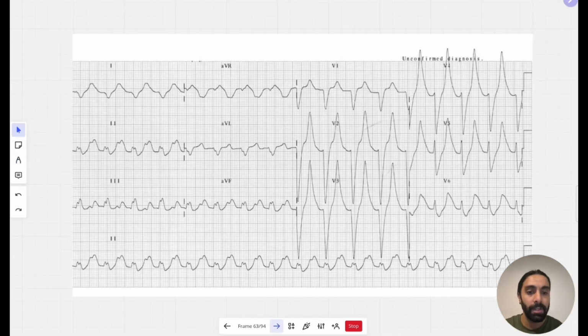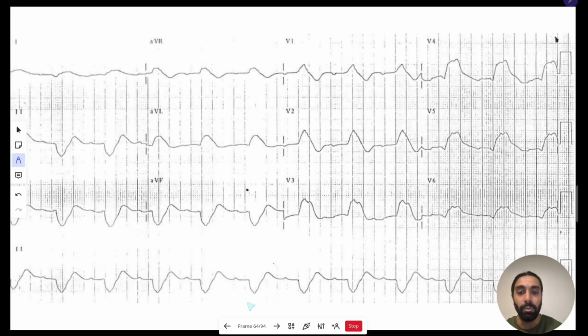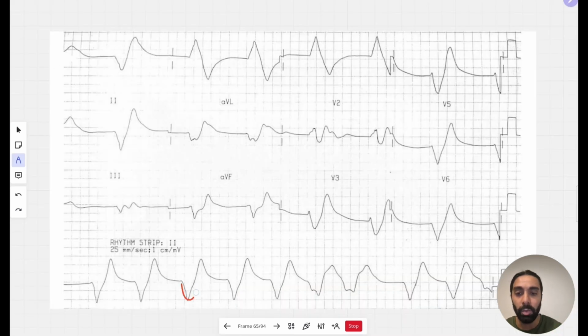If left untreated, you start to see these T waves are getting way, way bigger, and you start to see this irregular arrhythmia forming. So the QRSs are starting to get widened, and the T waves are starting to get widened, and we're starting to lose even the P wave. It's difficult to see what's the P wave and what's the QRS. And if you start seeing this, it is considered a sine wave, which kind of looks like an S. And it's just getting even worse here.